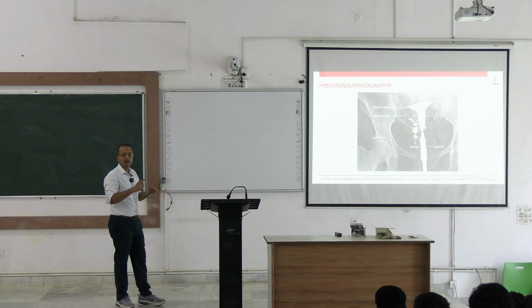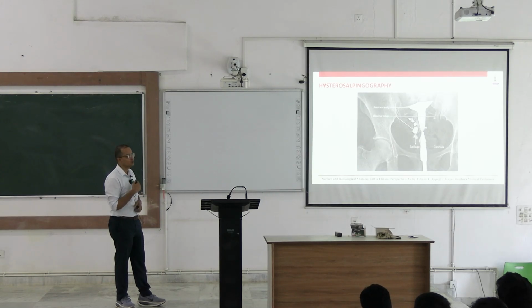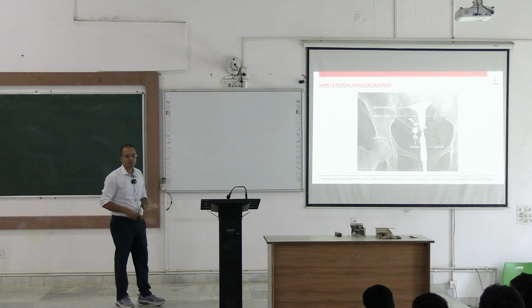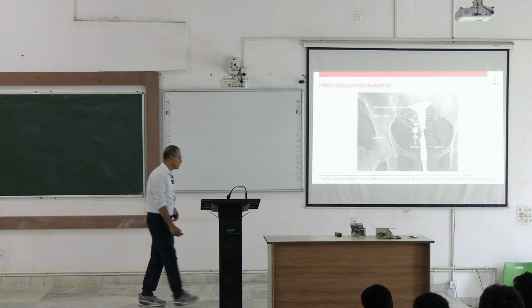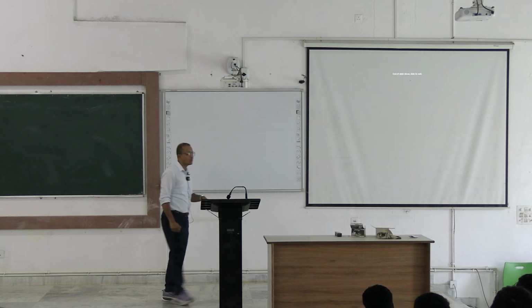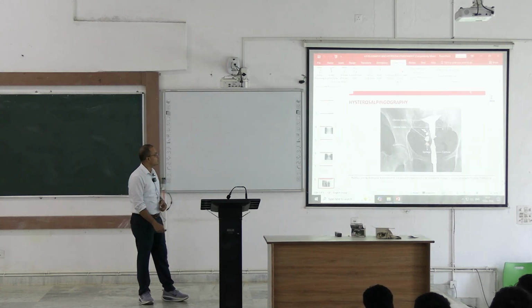You are seeing here any bony shadow, and whether that bony shadow is presenting any formation of joints or not. If it is, fine. Soft tissue, is it visible? Yes, fine. Then anything special you are seeing? Yes, you are seeing this particular reproductive tract. Which part of the reproductive tract you are seeing? You narrate it and we are done. So this is all about visualizing this system with special dyes in this particular region.